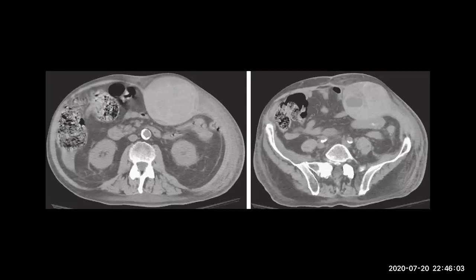Okay, sir, can I talk? You can talk. These are selected CT scan images at the level of the kidneys without contrast administration. There is evidence of a well-defined left rectus sheath lesion showing hyperdensity associated with perilesional fat stranding and soft tissue thickening on the left side. In the setting of trauma, I will put rectus sheath hematoma.